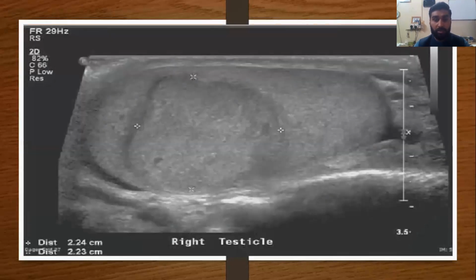One more non-seminomatous germ cell tumor, similar to the parenchyma of the testes. They are biopsy-based to diagnose.